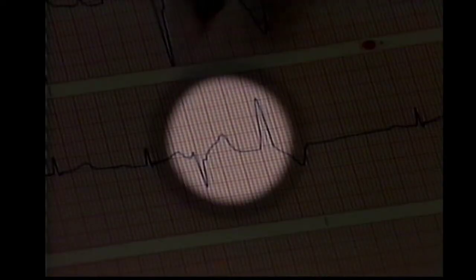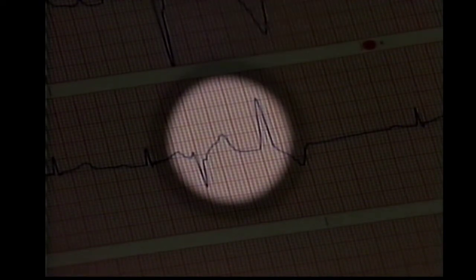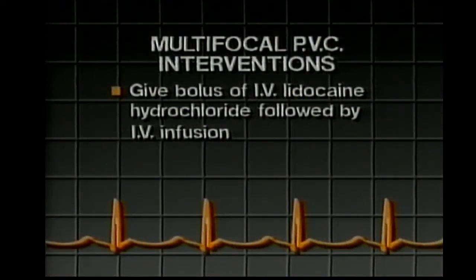Multiformed or multifocal PVCs may also develop. The morphology of each is different because they originate from different ventricular ectopic sites. Multifocal PVCs are serious because they often progress to ventricular tachycardia or ventricular fibrillation, especially in patients with acute ischemia. Treatment must be immediate. A bolus of lidocaine hydrochloride followed by an IV infusion of the same drug is recommended.